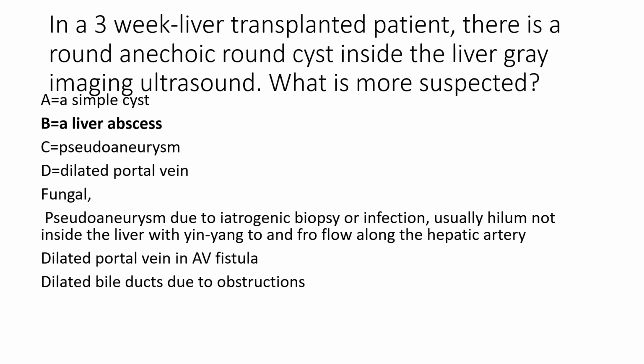We should think about liver abscess, or if it is in the hilum, we should think about pseudoaneurysm in the first days of transplant, or when we do a liver biopsy, or a dilated portal vein due to AV malformation, or dilated bile ducts.